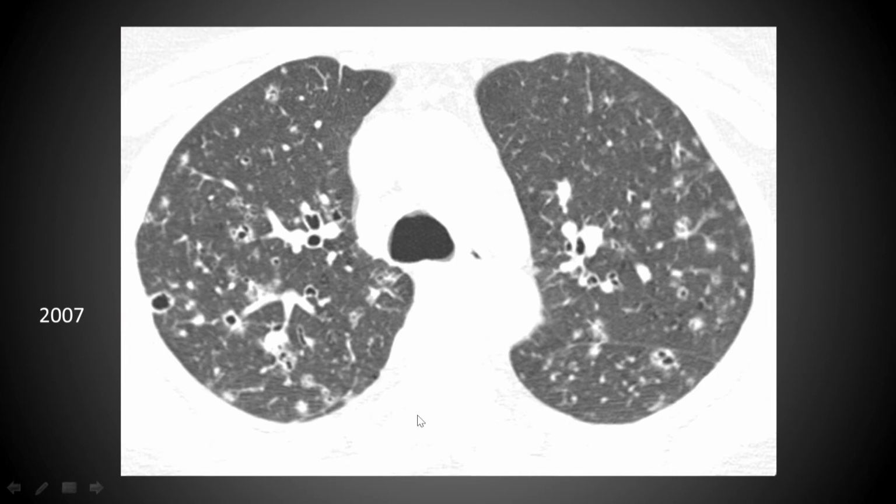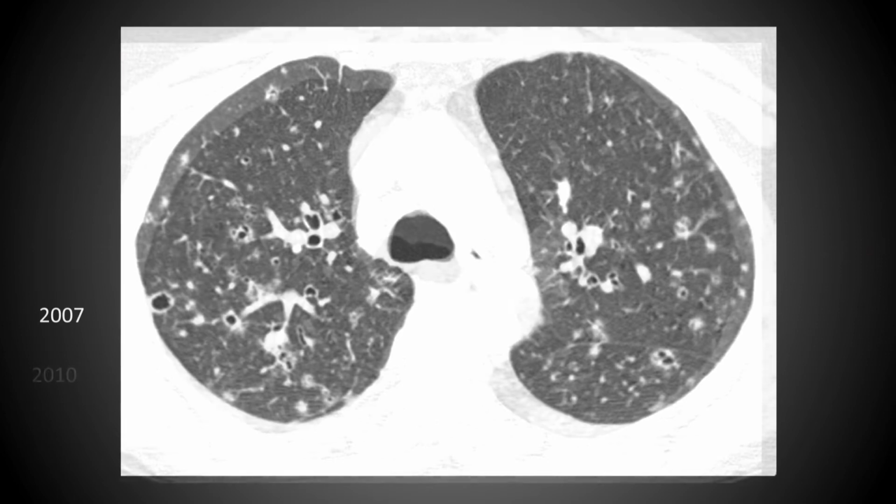And you're going to see this quite commonly, not always this severe, but you may see a few manifestations. And it can get a little challenging when the patient also has some centrilobular emphysema. So the centrilobular emphysema has black holes that don't have discrete walls, whereas these have discrete walls.